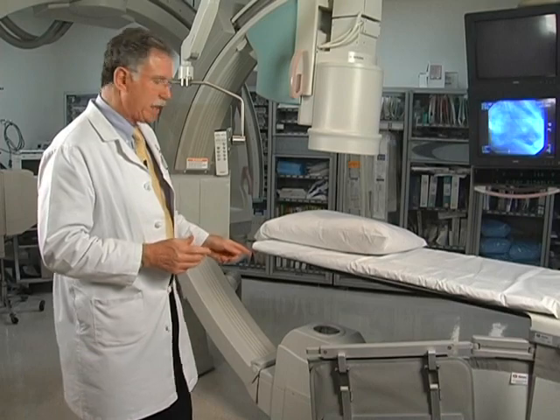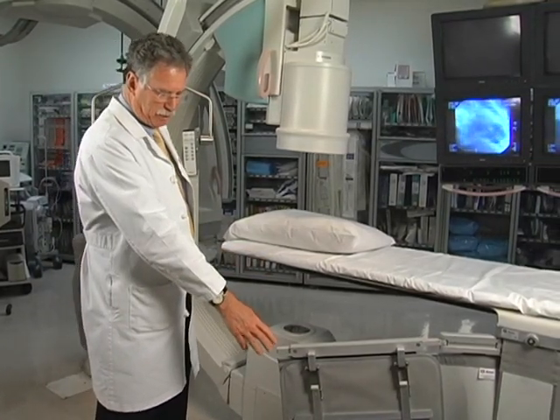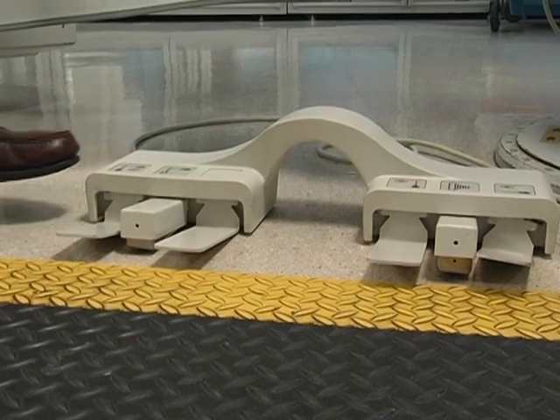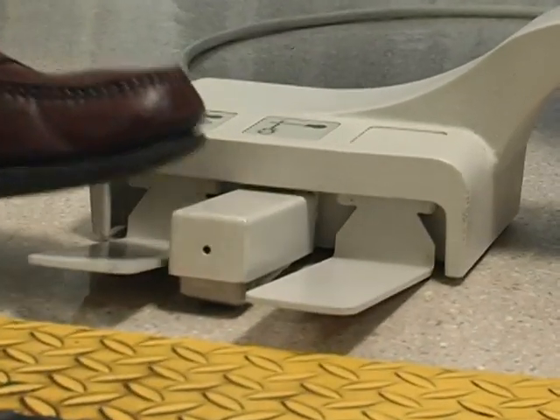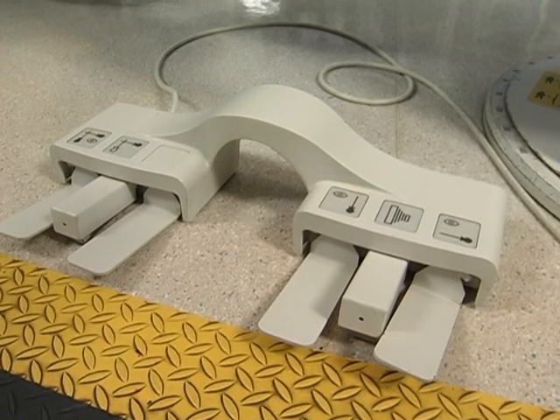Now, we use radiation in 2 ways in the cath lab. When we step on our activation pedals, which are shown here in the bottom, these pedals have triggers for fluoroscopy only, which is this flat pedal, or for the activation of the cine angiographic mode, which has 10 times the radiation dose delivered because we have to record those images on our video chain for storage. So we have the ability to do fluoroscopy and cineangiography with those different pedals.